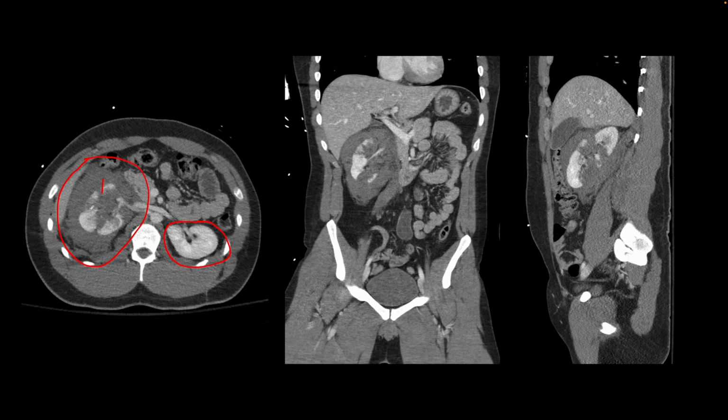There are these linear structures that are going through that hematoma into the renal sinus. So these are lacerations, and so there are multiple lacerations in this kidney, and I'm pointing them out on all the different planes, and we don't see any IV contrast extravasation. But can we comment on urine extravasation?